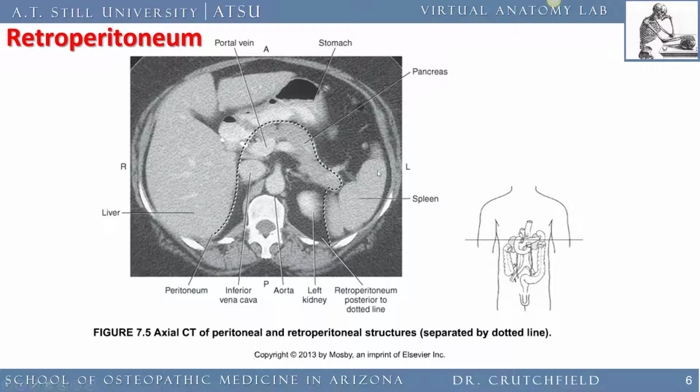And we can see the spleen, and we can even begin to see ligament coming off of the spleen at the hilum. Not yet well seen. But for this talk, where we're going to be talking about the retroperitoneum and the kidneys, we're talking about this area back here that will include both kidneys, the adrenal glands, the aorta, the vena cava, the pancreas, and in this example, portal vein and splenic vein.